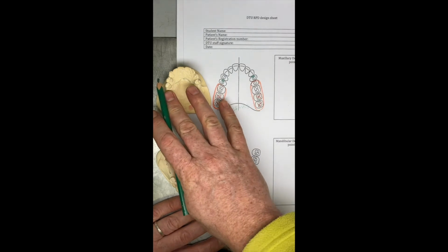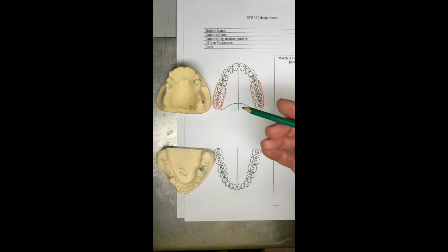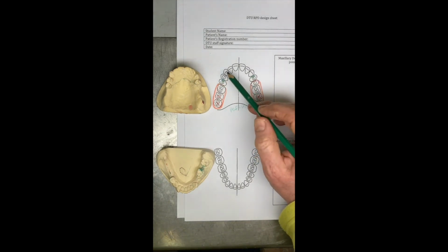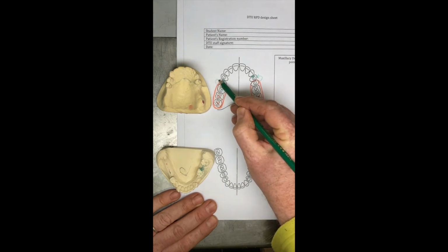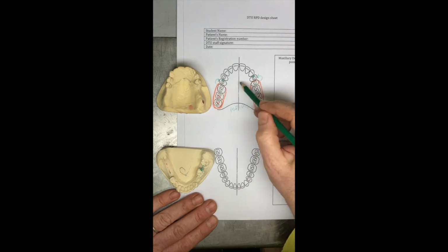because there's very little undercut here, so I wouldn't complicate matters. Remember, these are the simple cases where you can engage the undercut because there's nothing restricting the path of insertion, but here we've got very little undercut on the distal aspect. We have got nice undercut on the buccal aspects of the teeth, so we can put some clasps on. On these premolars, I'd be inclined to go for gingivally approaching clasps because they're towards the front of the mouth. We can keep the clasp arm nice and long. Remember, these need to be somewhere in the order of 14 millimeters long to remain flexible, so they don't go beyond the elastic limit.